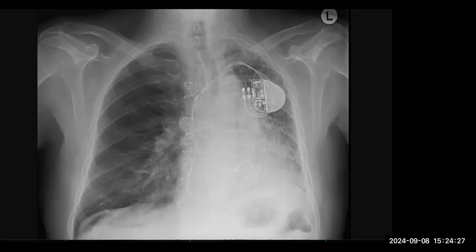Apart from this, I'm looking at the bones to look for any findings. I do not think that there is any. For correlation, I would discuss this case with the clinician and ask them whether the patient had recently had any surgery that would explain this abnormal air focus under the diaphragm. If there has been no previous surgery and the patient has some symptoms, then I would raise a concern for this. I would urgently inform the referring team of this pneumoperitoneum and suggest a contrast enhanced CT of the abdomen to further characterize the findings.